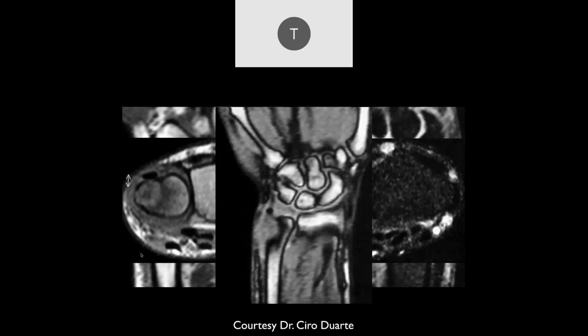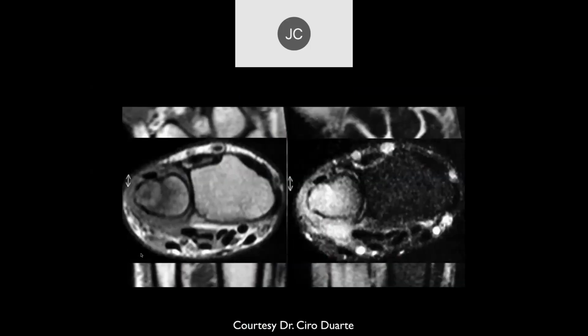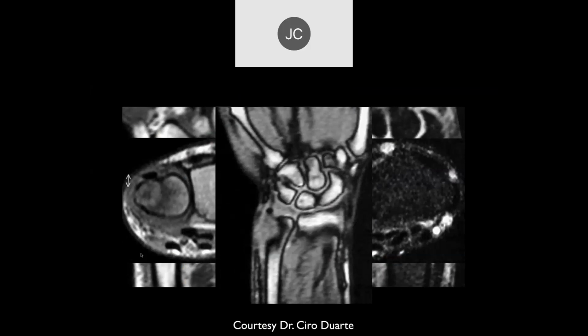This is from Brazil. Yeah, I guess again an infectious process. TB. Yeah, this turned out to be a fungal infection with granuloma. I don't know which fungus, but this was a fungal infection.